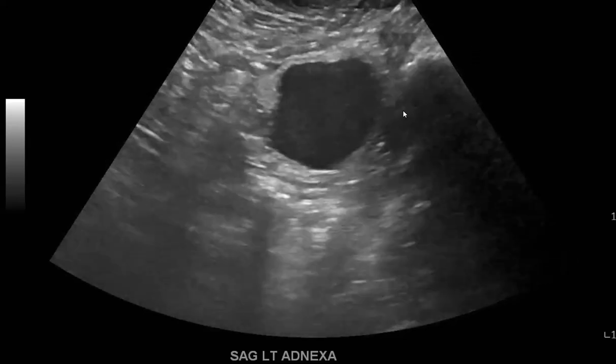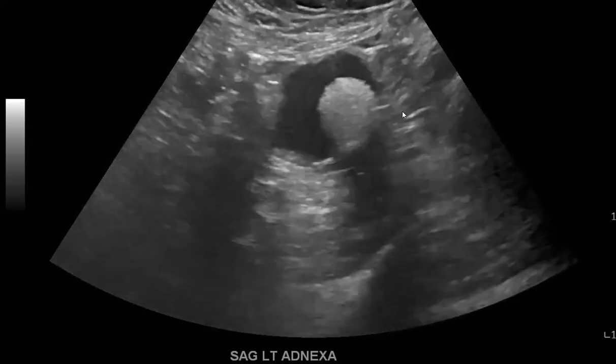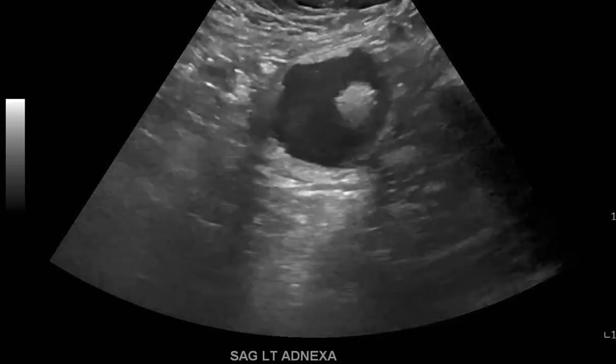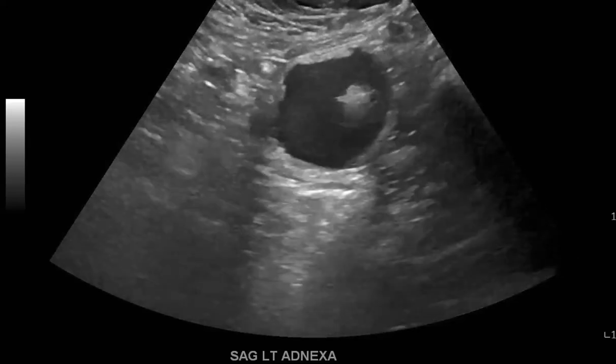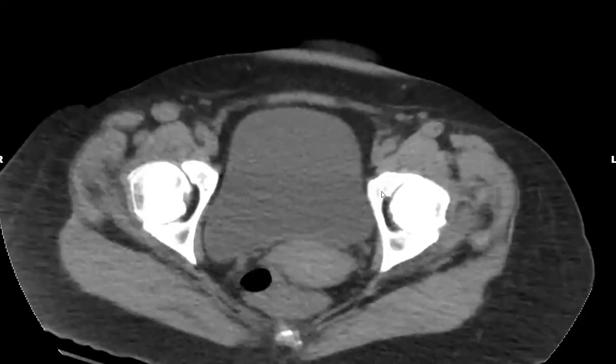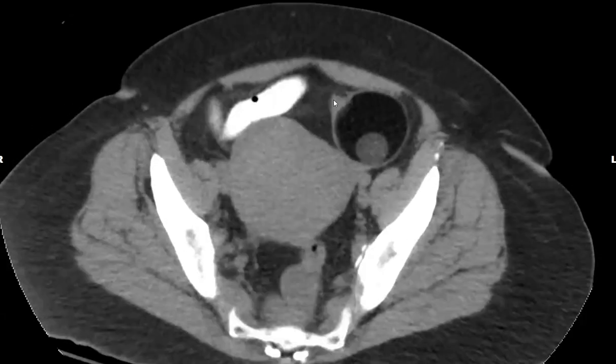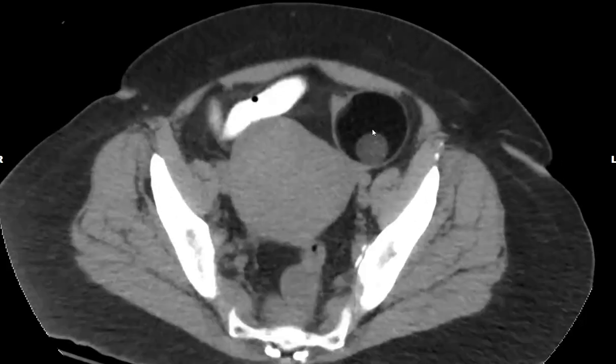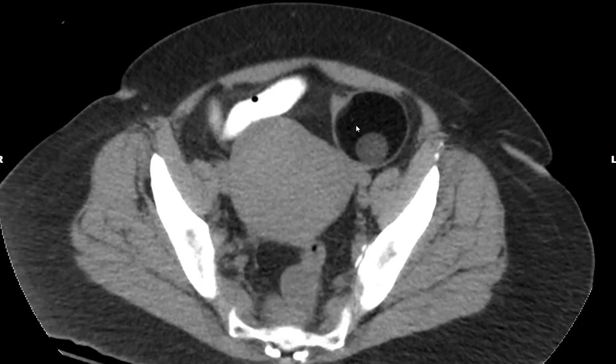Now we'll go over the CT scan of this same patient and look at these same findings of the dermoid cyst on the CT. So on the CT examination in the left adnexa, you can see there is this well circumscribed mass lesion containing low density material predominantly, that is similar in density to fat, so predominantly fatty material, and this cystic lesion is predominantly occupied by fat material.